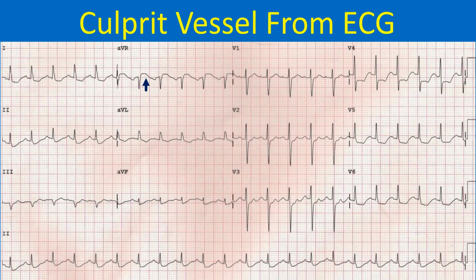Clinical evaluation and X-ray chest showed features of pulmonary edema. Angiography done after initial stabilization with intensive medical management showed severe stenosis of distal left main coronary artery along with multiple lesions in all the three vessels.